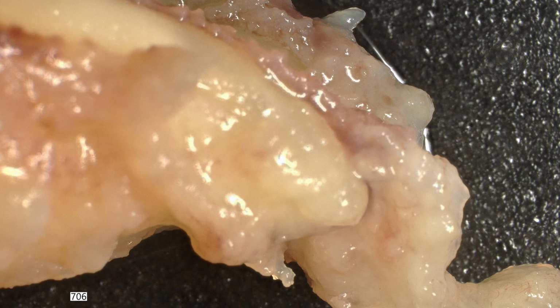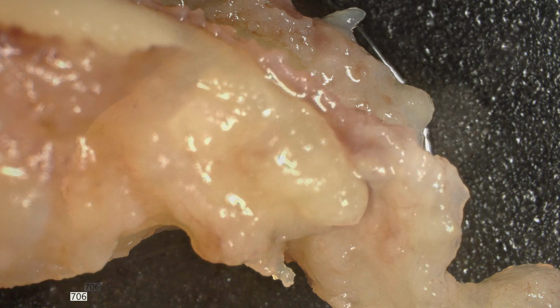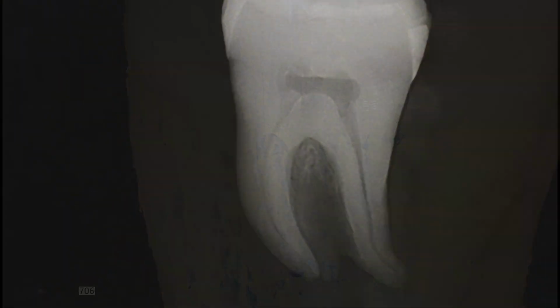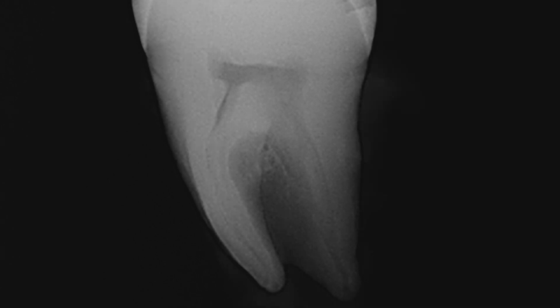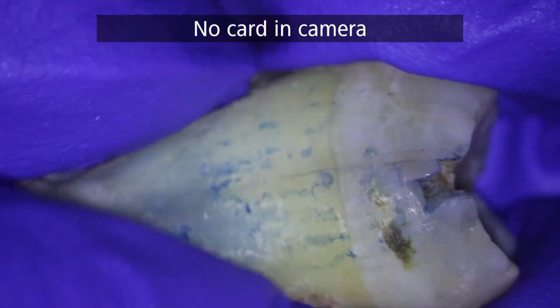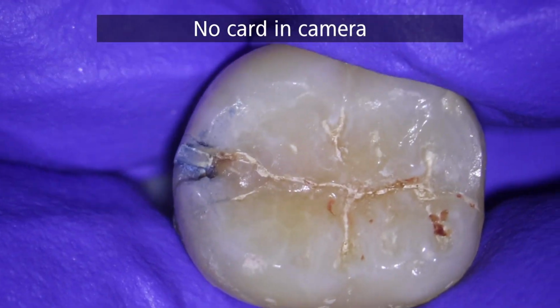It's just simply a necrotic tooth, and we want to look at the biofilm in a necrotic tooth that has not had any irrigation. We took some pictures, tried to get some indication of the vertical fracture of the root. These are the radiographs that we took prior to sectioning the tooth. So it was a difficult tooth to section because it was a fused root with a connection in between.